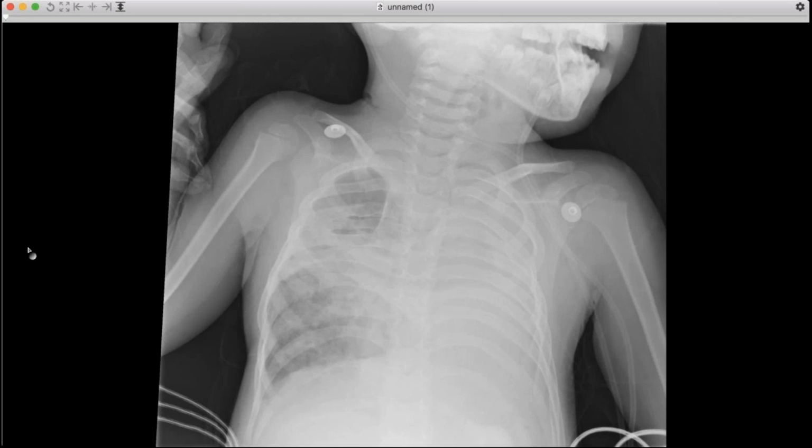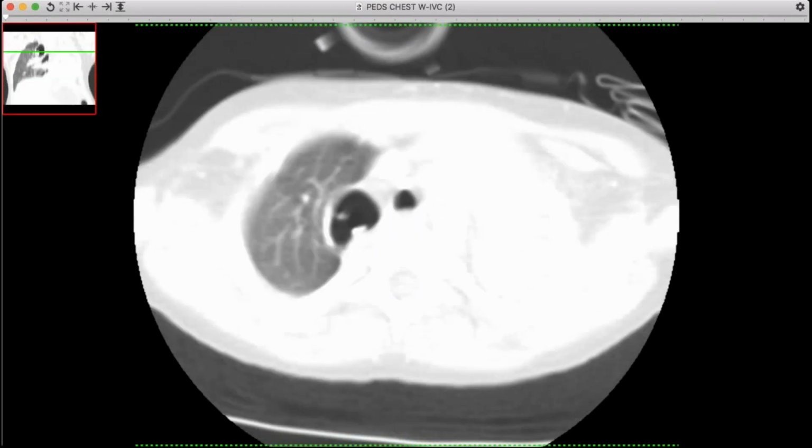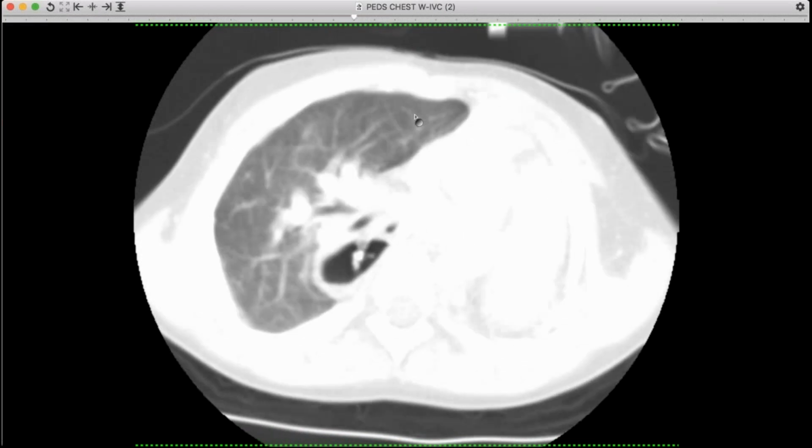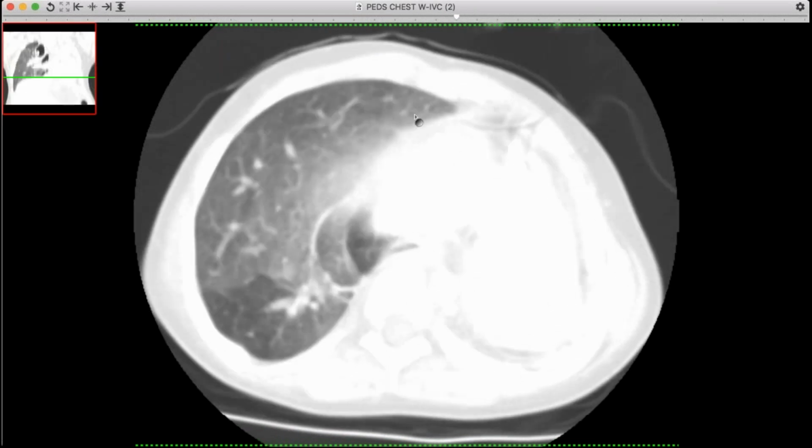That would be my only explanation for that, and his weird looking esophagus. But the other lung grows. I should show the lung windows. But the other lung, you can see, develops, and this was when he was still a child, will develop normally and supply adequate ventilation. Do you have adult imaging on this?